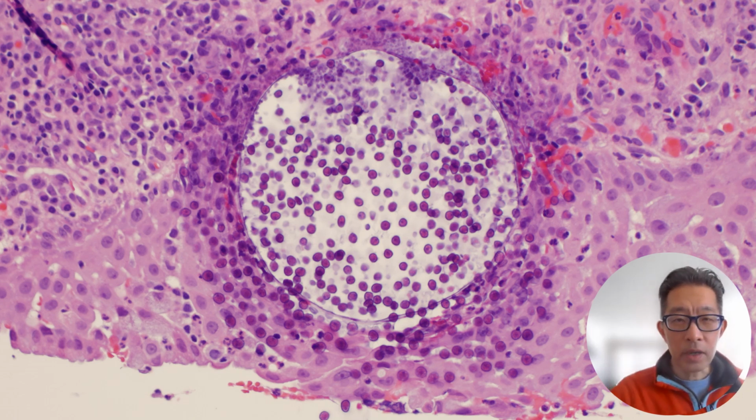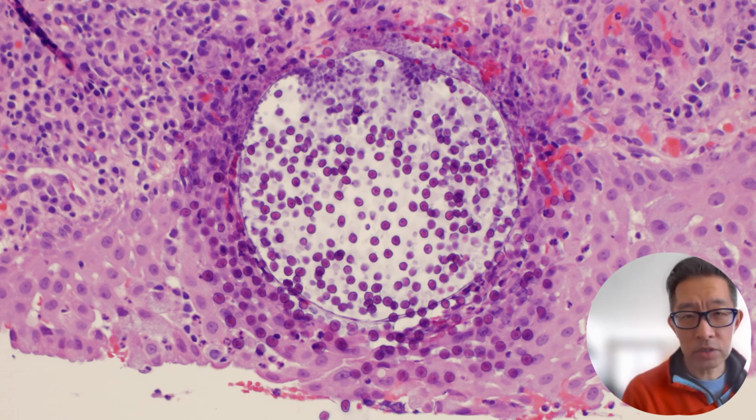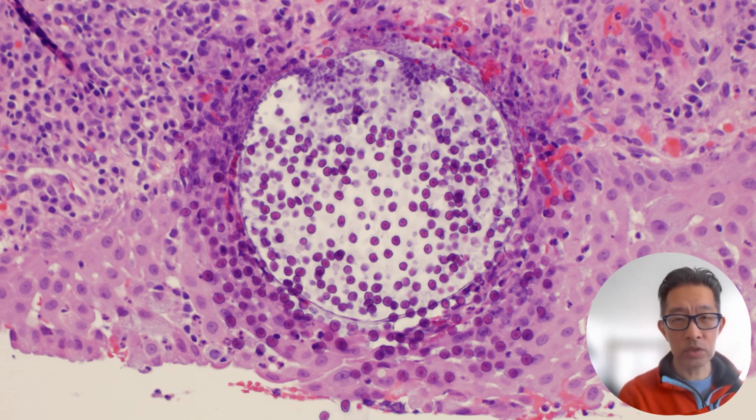And here's a close-up of the vacuole, or that little rounded lesion inside the papillomatous sample. And you can see it's very characteristically clear on the inside with basophilic elements internally and also surrounding inflammatory cells. What is this? This is rhinosporidiosis, caused by an organism, Rhinosporidium seeberi, which is thought to be either a fungus or a protozoan. It's been multiply characterized or classified over the years.